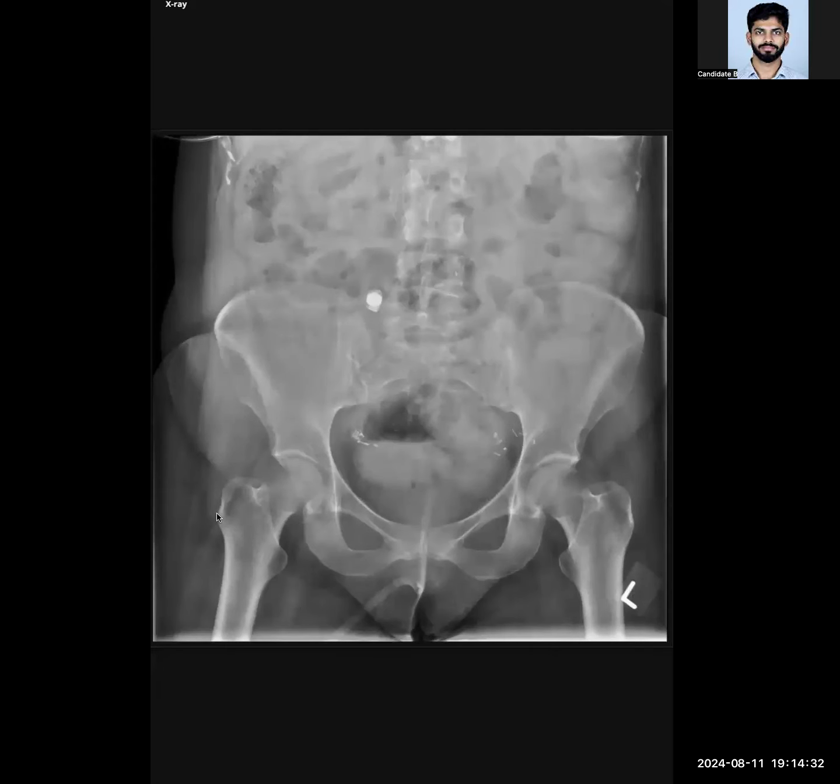Provided is a frontal position radiograph of the abdomen and pelvis in an adult patient. The striking abnormality I can see is a calcific opacity overlying the right sacroiliac joint. Other than that, I can also appreciate surgical staples in the pelvis on either side, with some soft tissue also noted on either side of the pelvis.